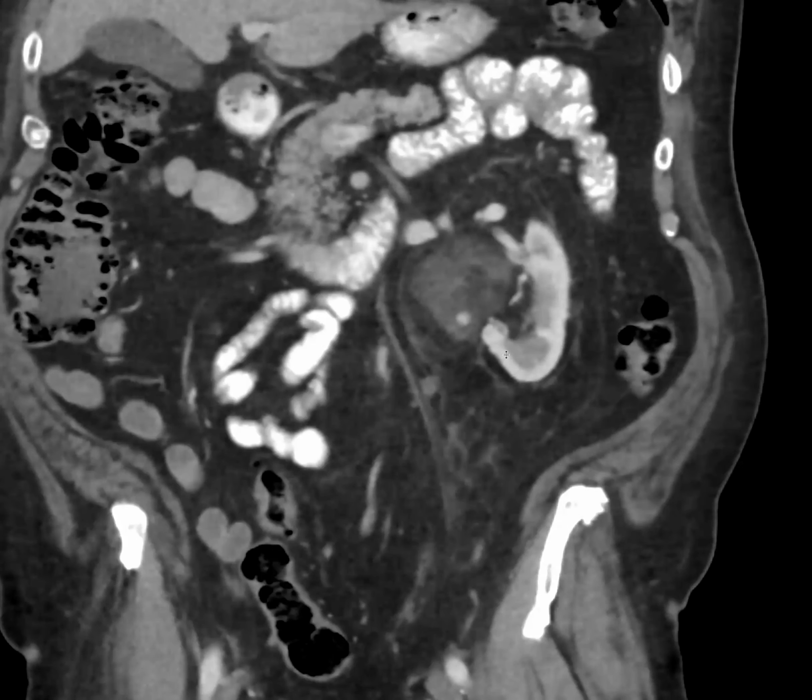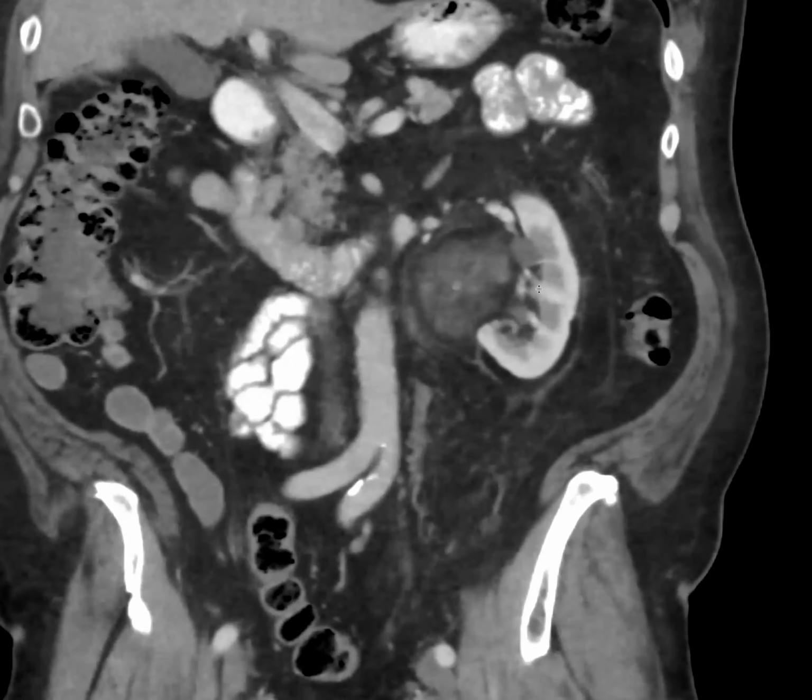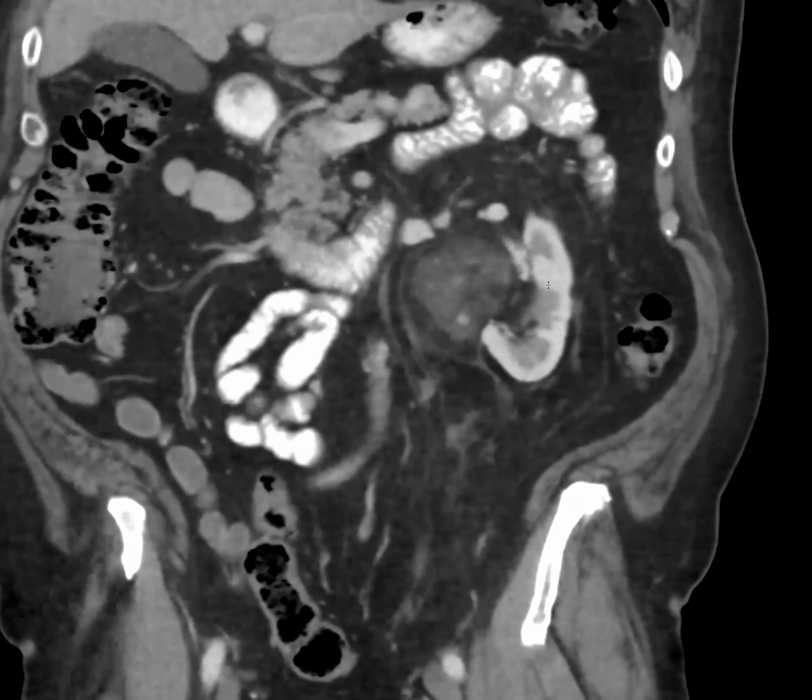So imaging-wise, the differentials are lipomas, liposarcomas, and AMLs. But for us to raise the possibility, they're benign looking. They will have a density on CT between the fat and the skeletal muscle. The density is not always fat, but it'll be somewhere between the fat and the skeletal muscle, well differentiated, and they do enhance. And on MRI, they'll have a T1 and T2 hypointense signal. They will not have a fat signal, but a T2 hypointense signal, and they will enhance. So that's the finding. They will not have any infiltrative features.